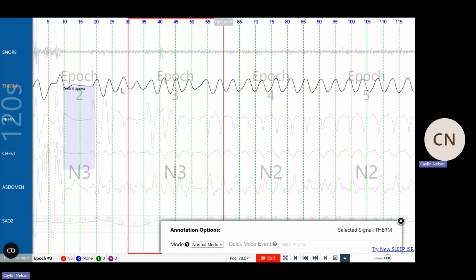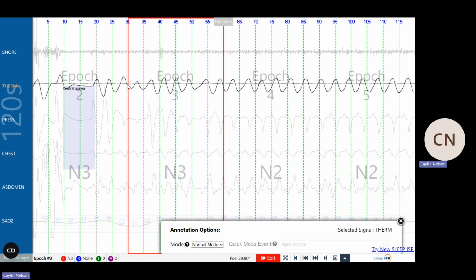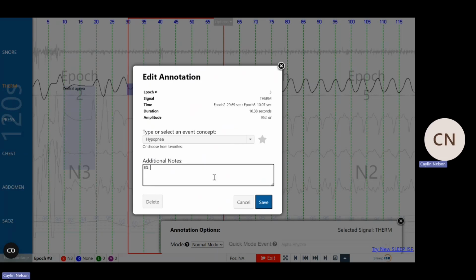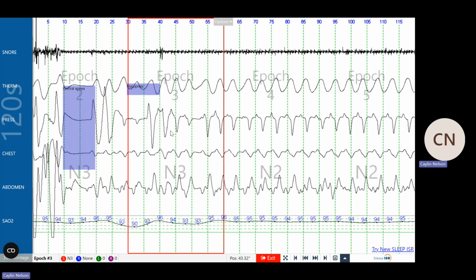But you can see in this area here between 25, around 30 to 40, you see those two breaths. Honestly, I highlighted just those two breaths, but the two breaths before them could be included as well, perspective wise, especially looking at their previous breaths. But there was that 3% desaturation coming from 96 down to 93.